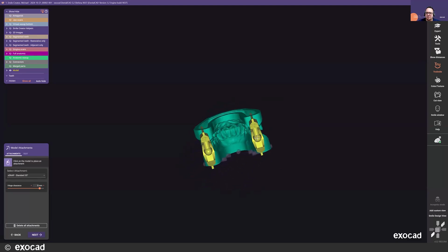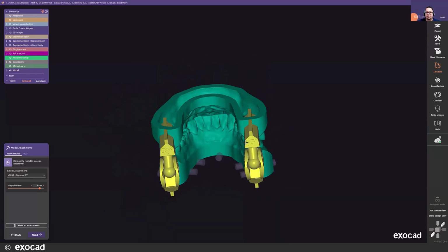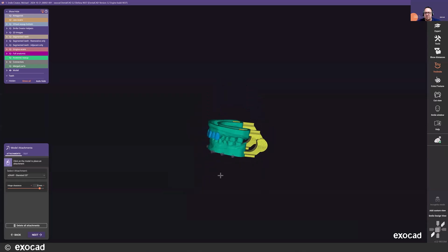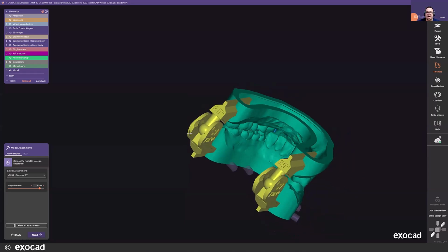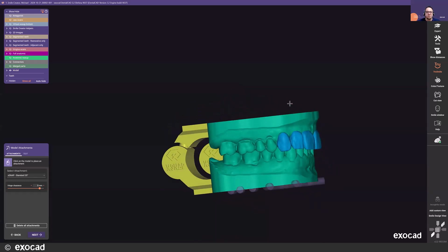I can see this is a ball and socket style articulator type that's going to allow you to simulate jaw movements in your hand when you 3D print those models. It's going to allow you to rotate that position, and then you can left click and drag to change the orientation as well. It's going to keep those aligned to each other to ensure that it works properly. From there, there's the hinge clearance, so you can adjust the fitment of that ball and socket. You can really fine tune if you want more of a passive or a tighter tolerance when you're simulating those excursive movements in your hand with the model.